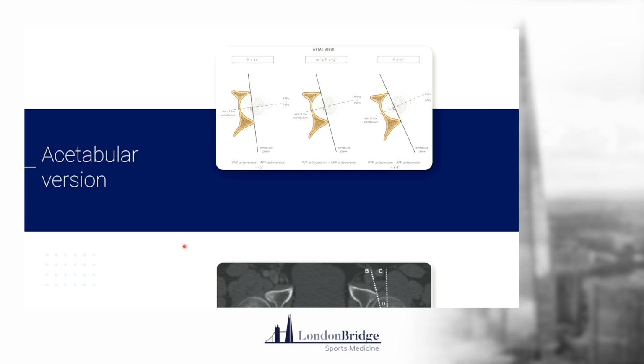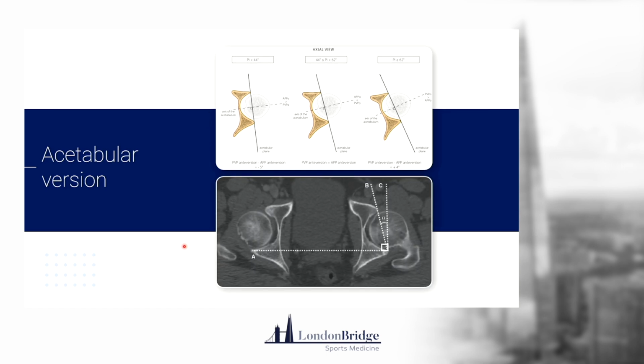So again, a further detail when we're looking at over coverage or under coverage, we talk about acetabular version. This is looking at whether you've got an under coverage or a dysplastic hip or an over coverage. This gives you that extra layer of detail because you get the axial view, the cross-sectional view.